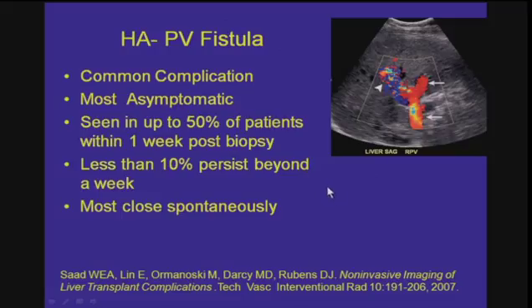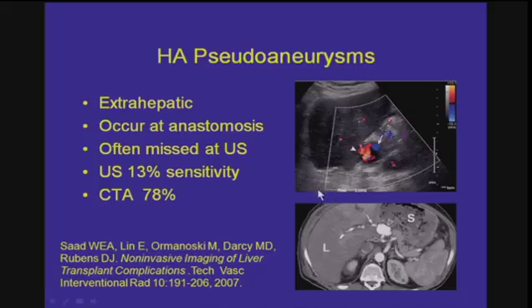So this is a common complication. As I said before, most of them are asymptomatic. They are seen in up to 50% of patients within a week post-biopsy if you look for them, but most of them will not persist beyond a week. So 90% will close spontaneously.